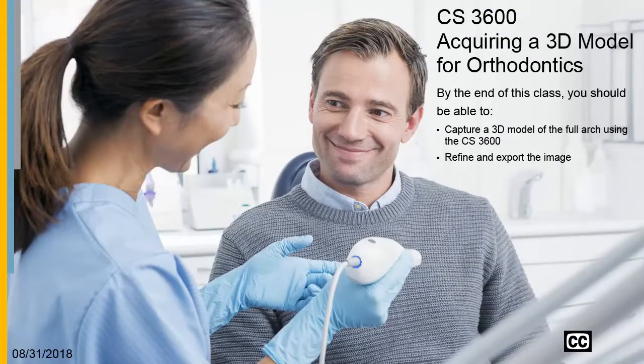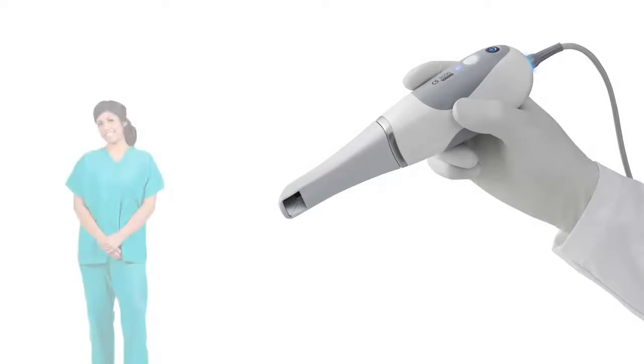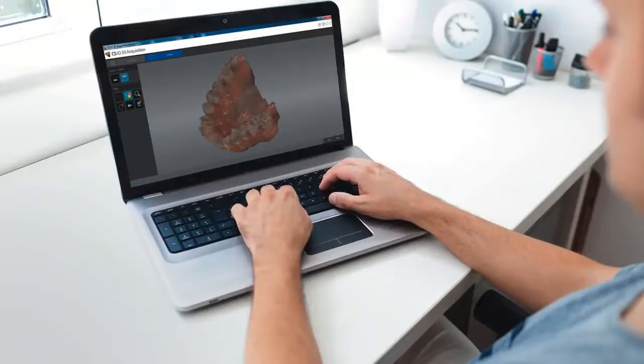CS3600, acquiring a 3D model for orthodontics. Welcome to CS3600, acquiring a 3D model for orthodontics. This recorded class is designed for clinical team members and provides instruction on acquiring a 3D model. You can export this model to the CS Model software.